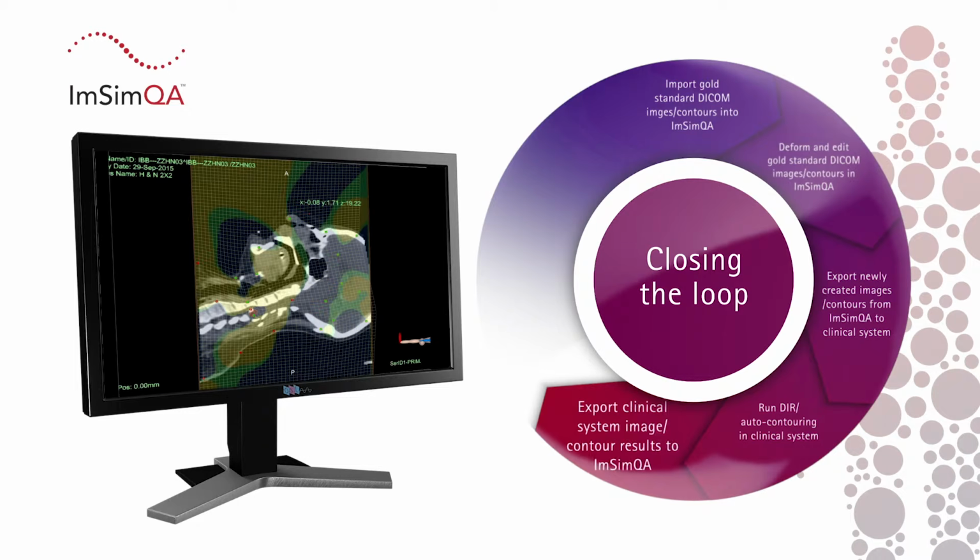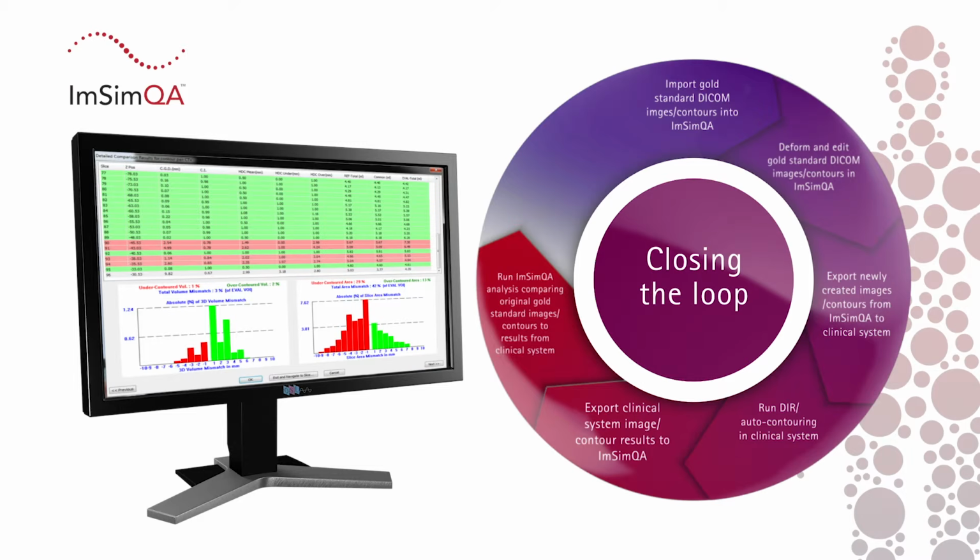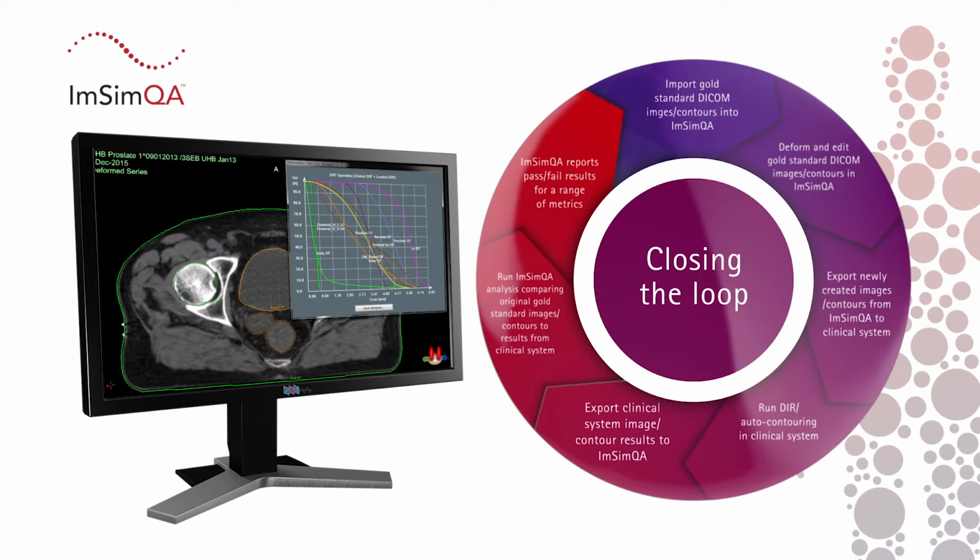Export the DICOM results to ImSimQA. Run analysis. ImSimQA compares the original images, contours and deformation vector fields with the results output by the clinical system. ImSimQA then provides definitive pass or fail results using a range of metrics.